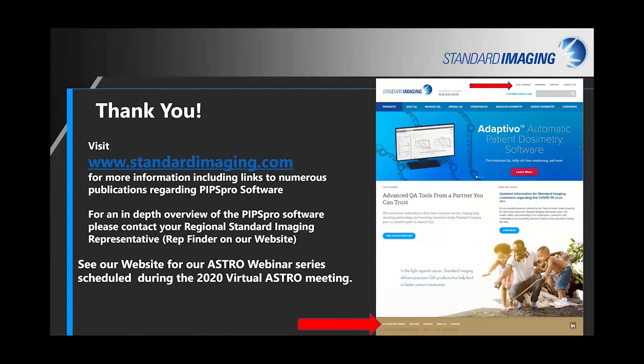Apologies for the little snafu in the middle, but like I said, this is a beta, so we're finding things like that and fixing them before it goes out to the users.